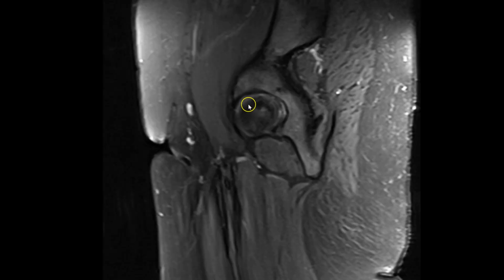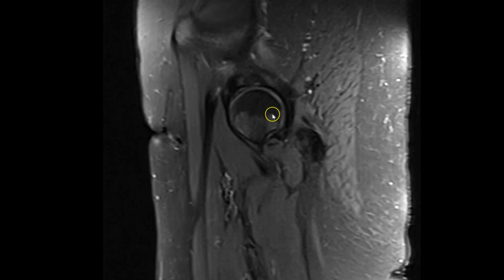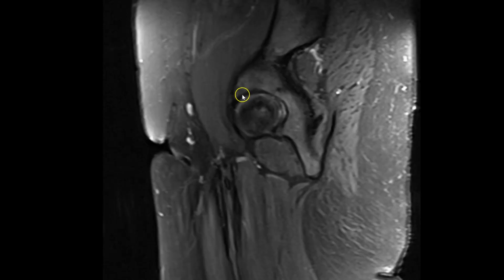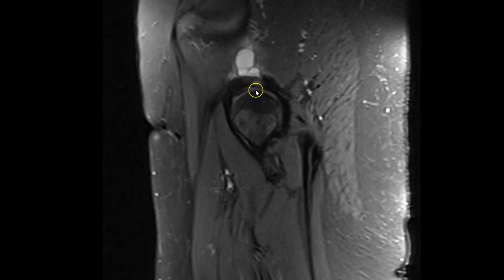If we look in the sagittal plane, here is the innominate and the femoral head. I'll scroll through and you can appreciate, again, the labrum wraps around the hip joint here, around the acetabulum. Here's the anterior portion, there's the posterior portion. Oftentimes, a clock face is used to describe the location of the tear, with 3 o'clock being anterior. So you can see at about the 12 o'clock position here, there's internal heterogeneity, thickening, and a labral cyst forming in the region of labral tear.